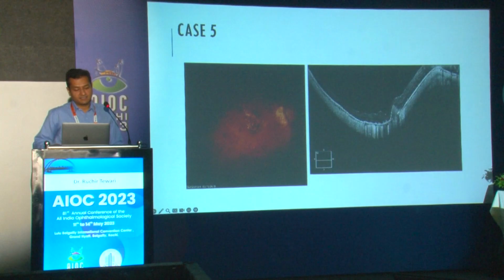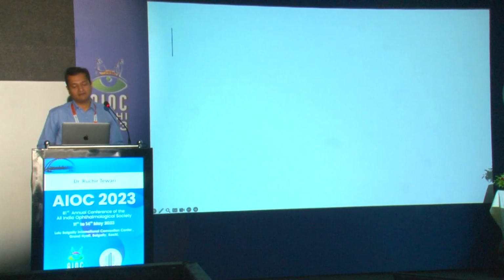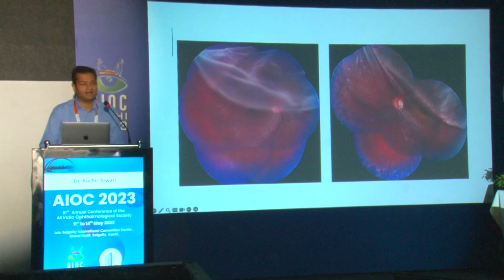This is the fundus picture in the post-op time, and as you can see, the retina is well attached, there is no macular hole, and there is a large CNV scar that is seen, which signifies the previous anti-VEGF treatment that the patient received earlier. Not all patients come to you with this, and there are certain other complications of myopia with a giant retinal tear and a retinal detachment, and Colonel Pradeep, I think, will take up on that.